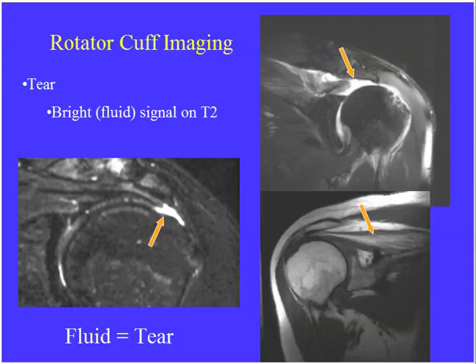Okay, rotator cuff tear is a very common entity that they like to show on these exams. And to diagnose a rotator cuff tear, again, you want to find that musculotendinous junction. If they show you a coronal image of the shoulder, follow that cuff all the way across, and you should be able to follow it all the way down until it touches the bone on the greater tuberosity. As we're coming along here, we see this area of high signal abnormality right in the location where the cuff is expected. This represents a full thickness tear of the supraspinatus tendon.